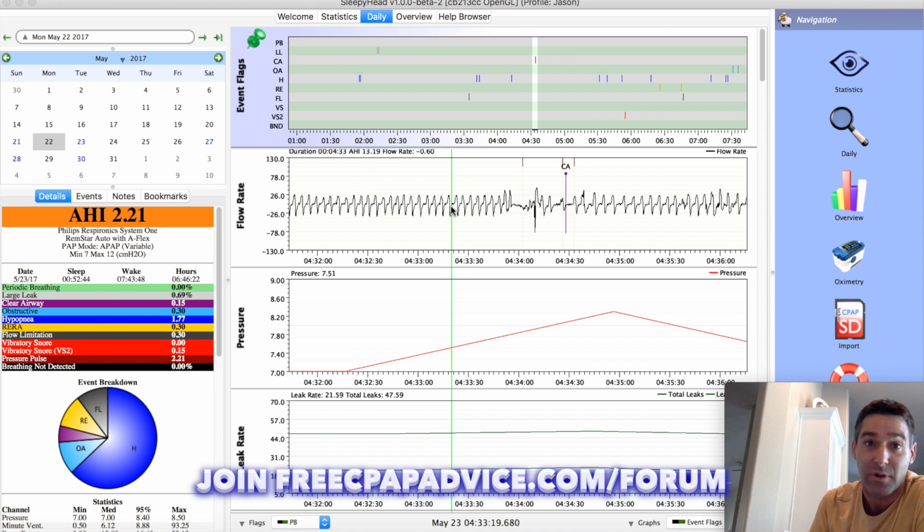If you need an example of this, go onto my website, freecpapadvice.com, and check out the central apnea tag underneath the main tag, which is sleep disordered breathing. And you can see what actual central apneas look like on the flow channel.